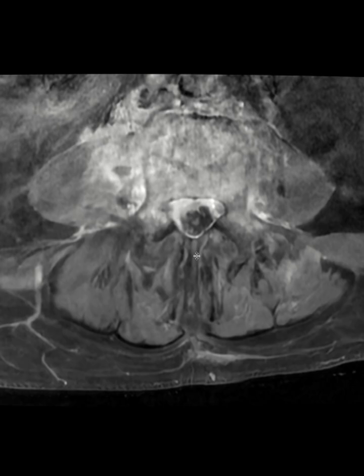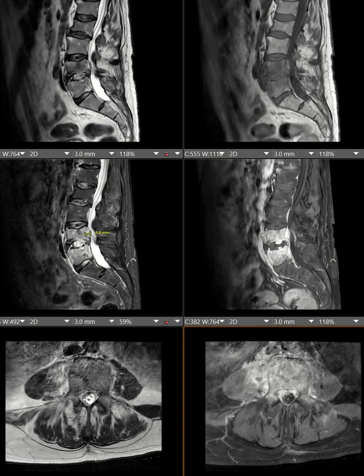So we have epidural involvement, and that's another important thing that differentiates this entity from regular modic type changes or inflammation. It's not going to go through the epidural surfaces, or it's not going to go to the extra osseous structures within paraspinal or soft tissue. So this is a very important distinction that you should know how to differentiate, modic type changes from Discitis Osteomyelitis. Okay, so this is one thing. We have to make sure that we are making a correct diagnosis.